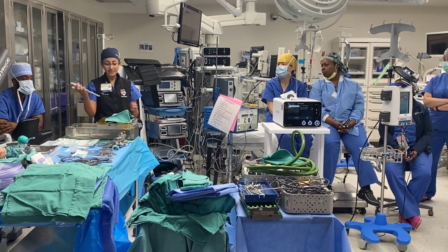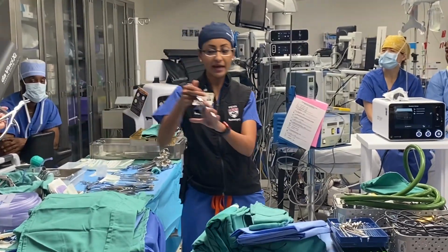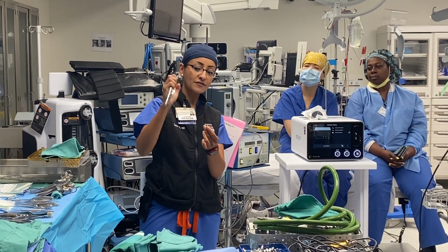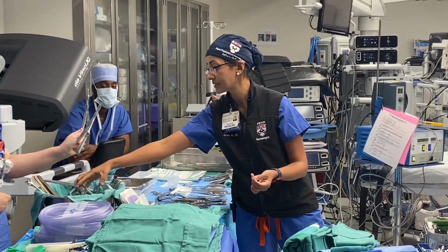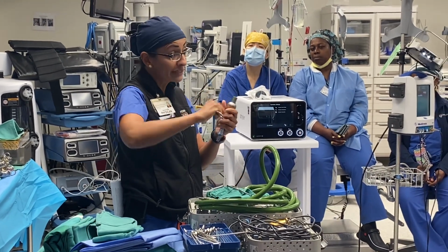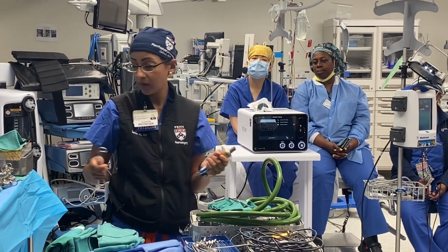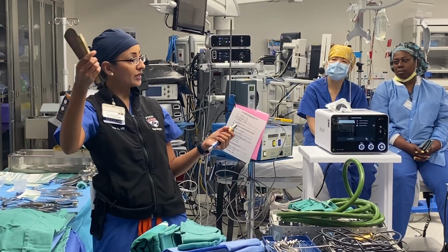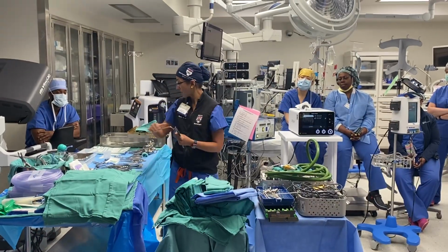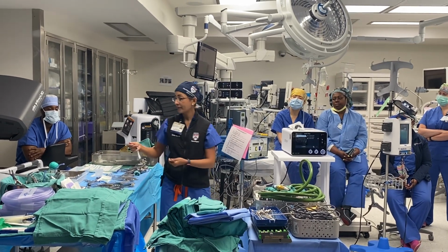Sometimes when we have to take off parts of the bone, well, the little Lempert here, these are tiny rongeurs. You guys see us use the big ones in spine, but sometimes at the head we'll need to take off small amounts of bone, in which case we'll use one of these. These are called Cushings. We like these especially when we're putting in burr holes near where the scalp is, because we don't want the scalp to get caught up in the drill. So you'll see us use this to pull that away. Brain malleables, if we're in a deep part of the brain, you'll see us bend these. Often we're using a patty with it to protect that brain, okay?